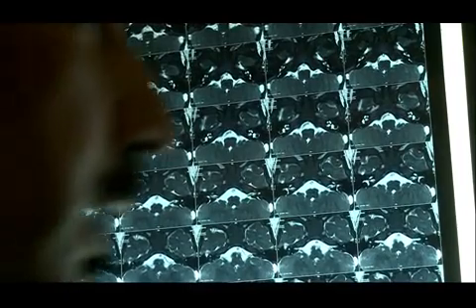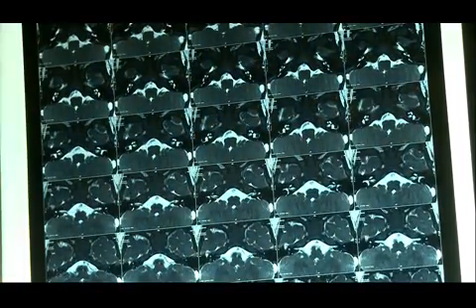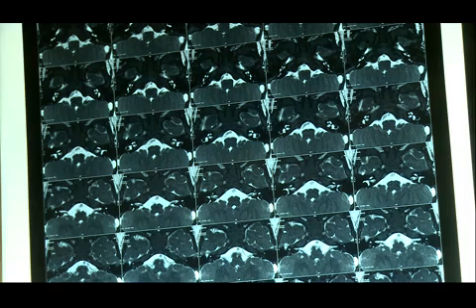So on MRI, only two things are most important for cochlear implant surgery: the nerves in the internal auditory meatus and the cavity in the cochlea. The fluid-filled cavity in the cochlea and the nerves are the two major prerequisites for a cochlear implant surgery. On CT scan, as I mentioned, you need to see a lot of things which can complicate your anatomy and surgery, and the aqueducts and the internal auditory meatus dimensions.